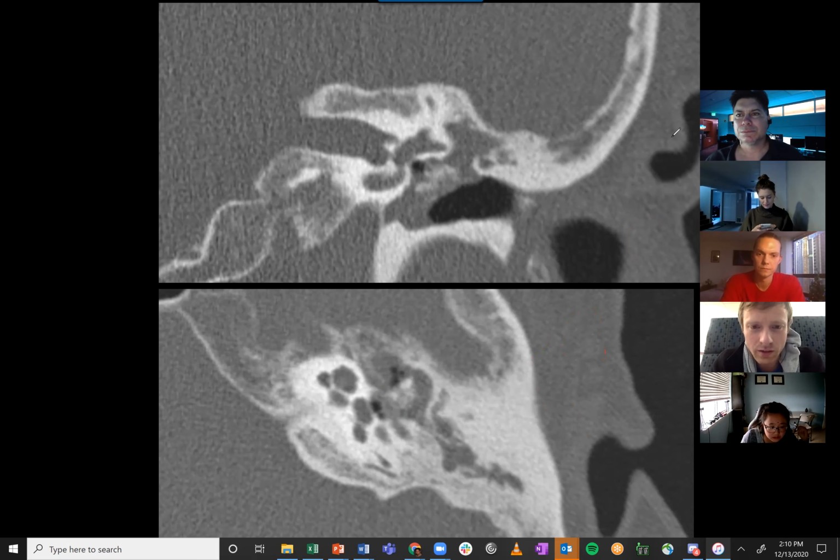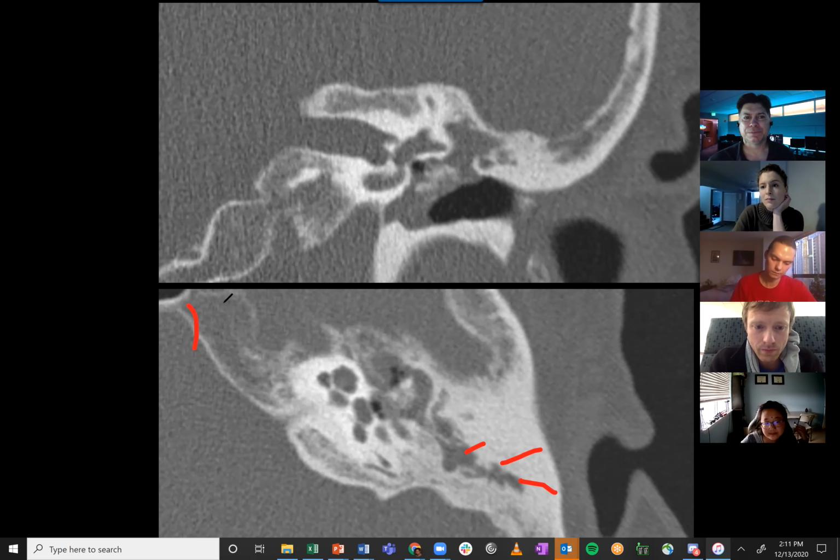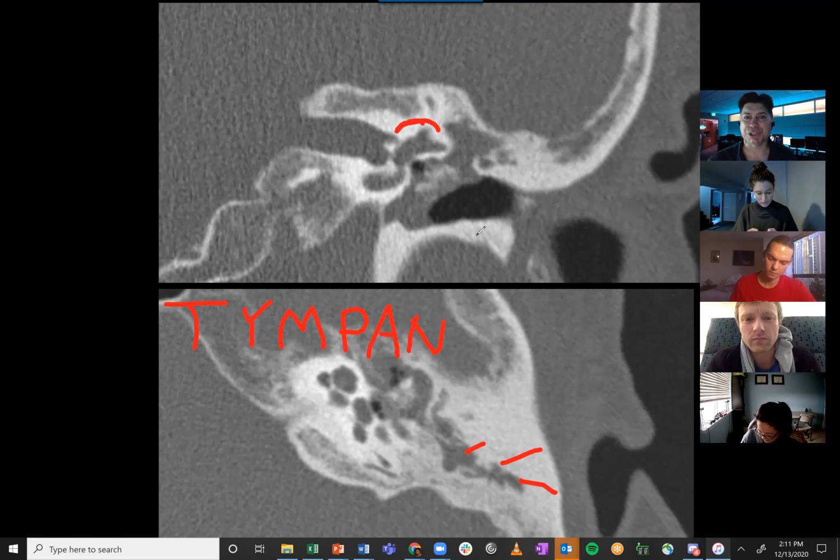What do you think of that, long-term chronic infection of the middle ear cavity? Do you know what that is? A confluent otomastoiditis? Yeah, but if you have calcification, what do you call that? Otosclerosis? Well, that's changes of the bone around the middle ear. This is changes of the middle ear cavity. Otosclerosis or otospongiosis is change in the dense bone that's around the inner ear.